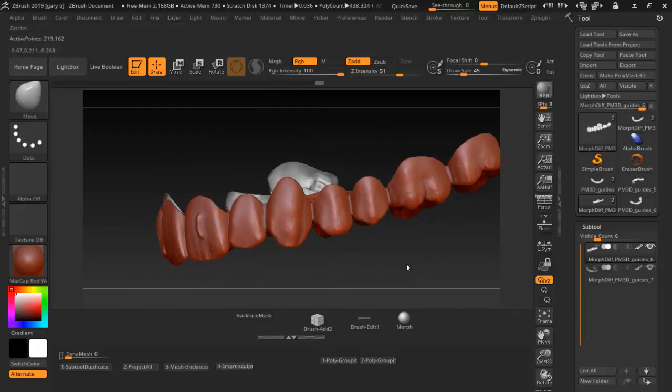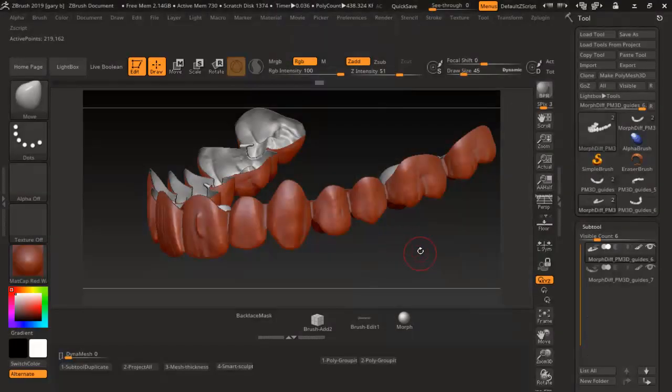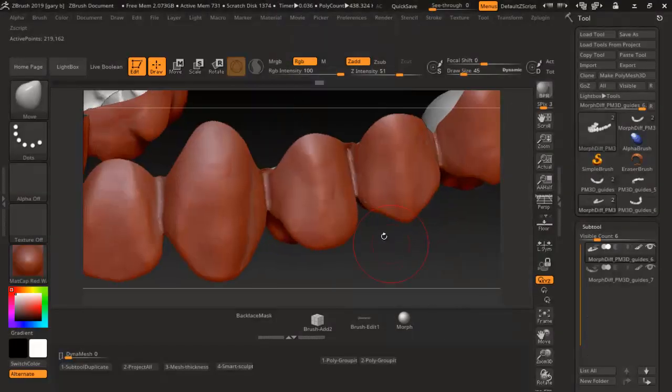And like I said, oops, damn key. Anyway, there's a little bit right here. I'm not worried about it. If you want to go ahead and morph that right now, you can. It's not a big deal. And you can come back here and just get rid of that. Of course, I have to kick the intensity up, just get rid of that all the way.